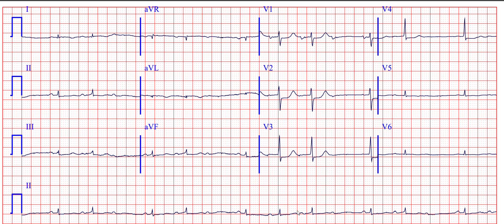The right coronary artery supplies the AV node, right, and the posterior wall. So you can guess that the right coronary artery might be involved because there is a problem in AV node conduction and ST depression in V1, V2.